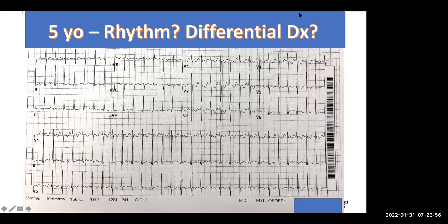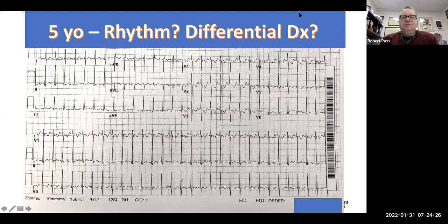Good morning, Dr. Best. Good morning, Colonel Bonsall. I'm trying to look at P waves in lead 1. Not very certain, but they look positive in 2. Just give me one moment. Please take your time.